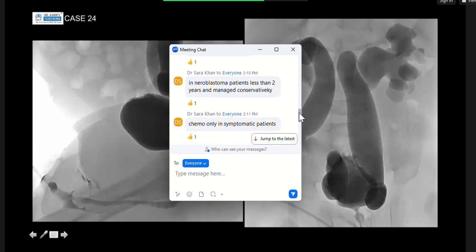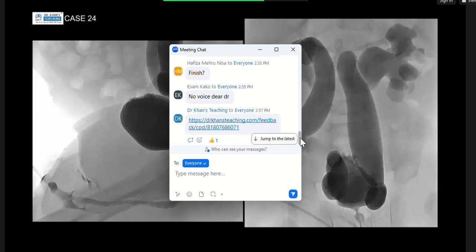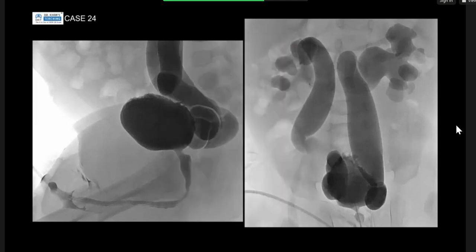I agree. Okay. So knowing that the posterior urethra is normal, what do you now think is the diagnosis, candidate 3? So bilateral vesico-ureteric reflux, and that's the definite abnormality, but the cause for this abnormality, I'd look for any cause such as neurogenic bladder or an obstructive cause.